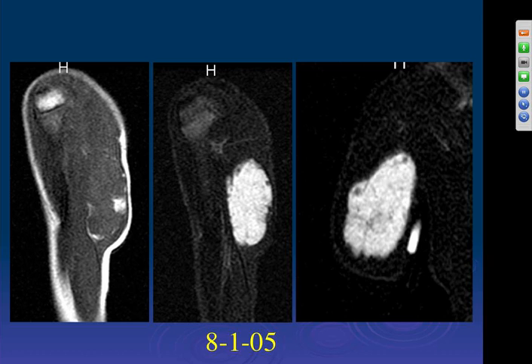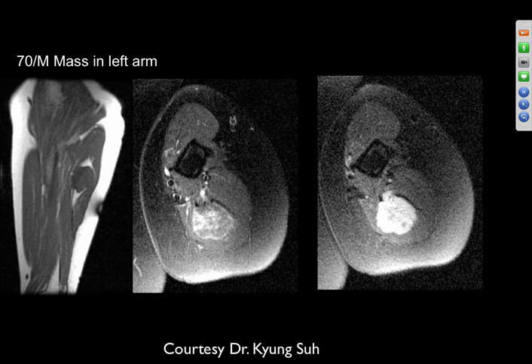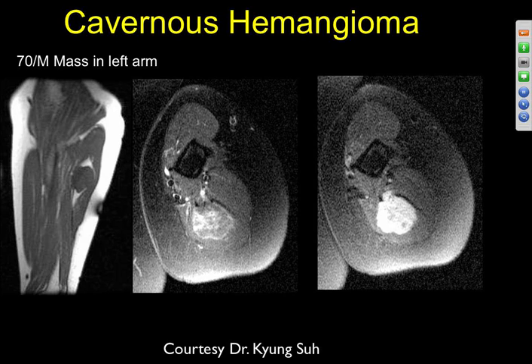All these solid soft tissue masses, you can't really be confident that they're benign. That's correct. They need to be biopsied anyway. Yes, almost all of them will be. Some of them, if they're typical hemangiomas with the fat going into it in septa, especially if you have phleboliths, you can feel comfortable. Lipomas that are completely lipid without any nodular areas within them, we can feel comfortable with. But most of the things in between, they're going to have to be evaluated, and you're going to have to make a tissue diagnosis.